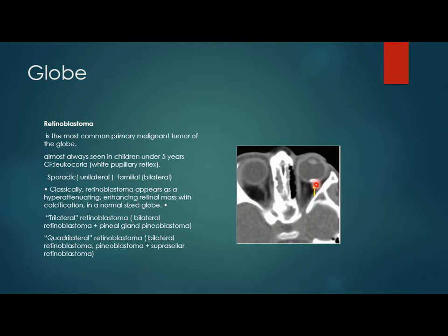I don't think so. Drusen. It's more like drusen than a retinoblastoma. Check the image. I checked on the internet. I bring it. I don't know. Yes, well, it looks like drusen. Yes, drusen, rather. This is an adult skull. It's not a child.